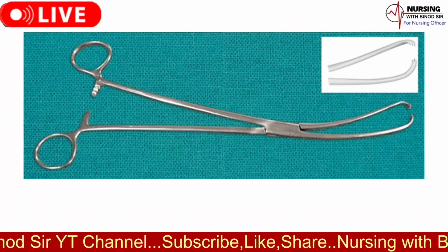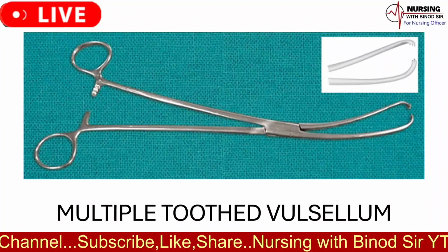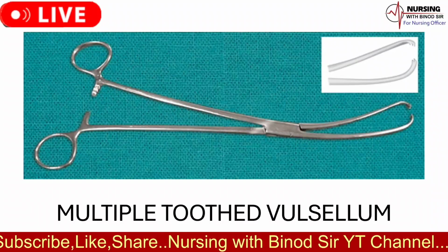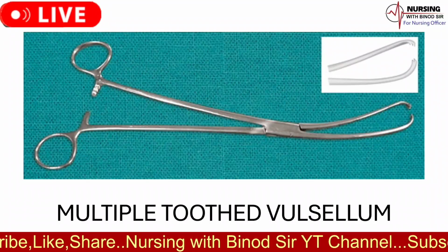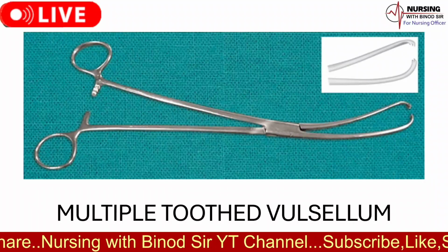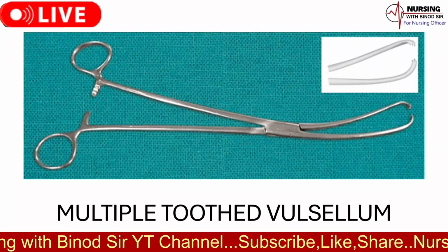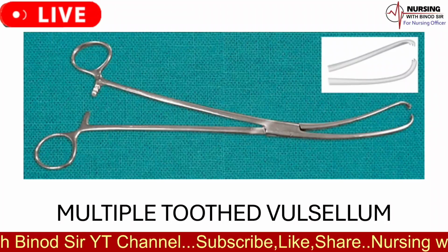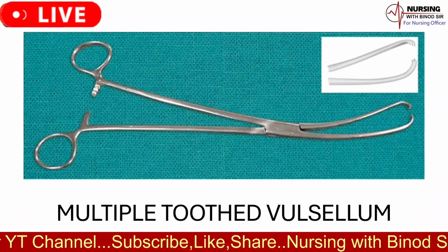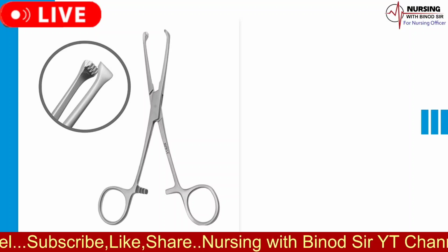The name of the instrument is multiple-toothed vulsellum. The uses of multiple-toothed vulsellum are as follows. 1. It is used to catch hold of the anterior lip of the cervix in D and E operation and suction evacuation. 2. As it produces trauma to the soft and vascular cervix, Allis tissue forceps is used instead.